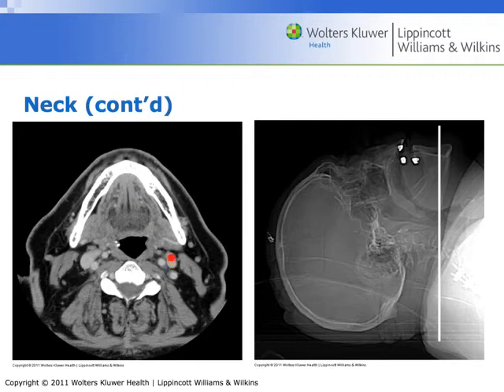The jugular vein. Vertebral body. Right there, it's the patient's right vertebral artery. These muscles are very long for the neck muscles. They're the sternocleidomastoid muscles. And this right here is the submandibular gland.